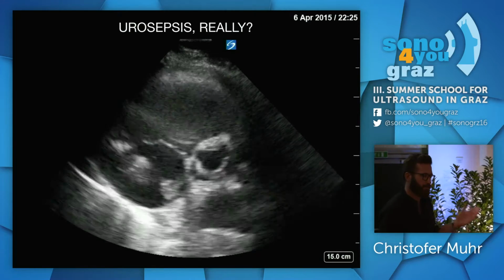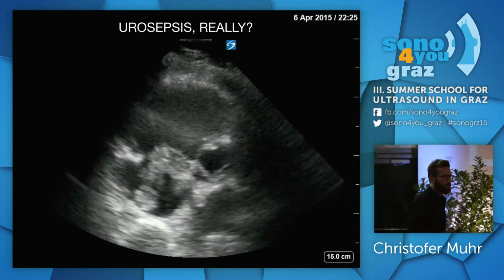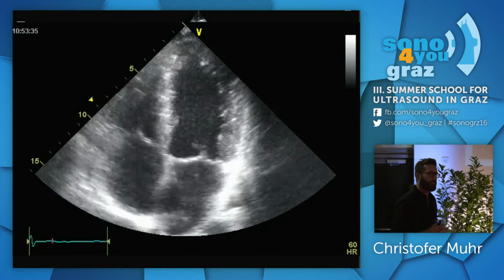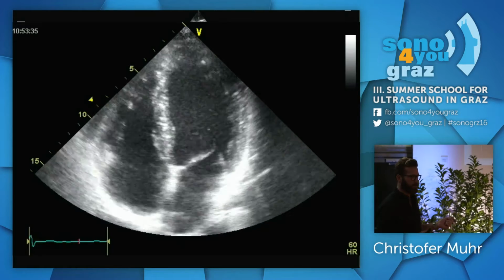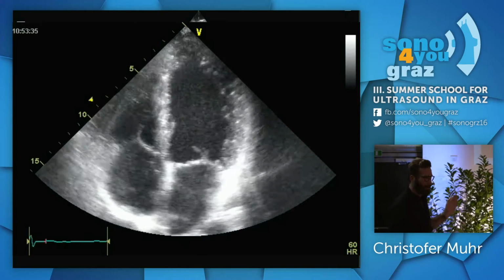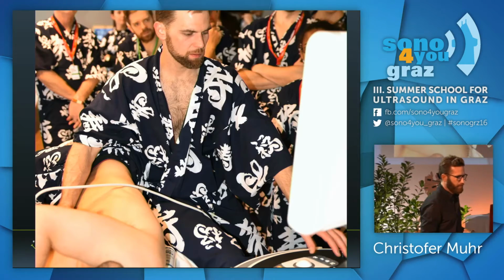In some cases, you can actually go in with catheters and remove it or give local thrombolytics and stuff like that. But in this case, they didn't need to do it. Okay, the first gray picture there is something that we're all going to see in the beginning when we do cardiac ultrasound. But hopefully, with a couple of training, at least 100 times of training, you will definitely be able to get nice images like this, okay? So don't give up when it comes to cardiac ultrasound.